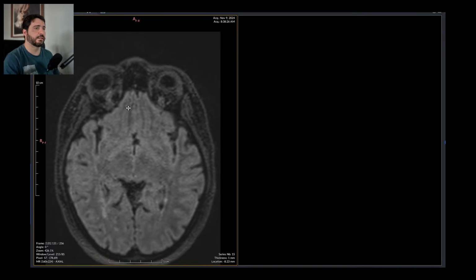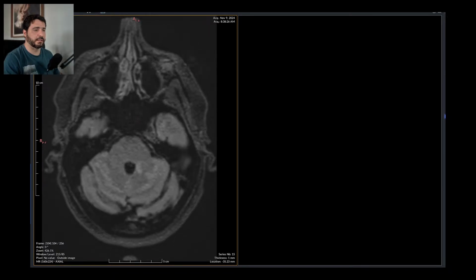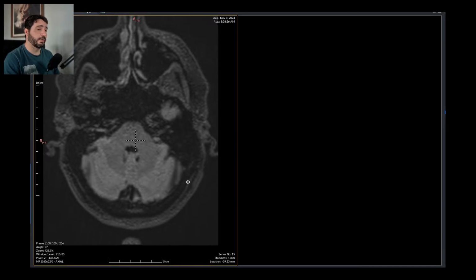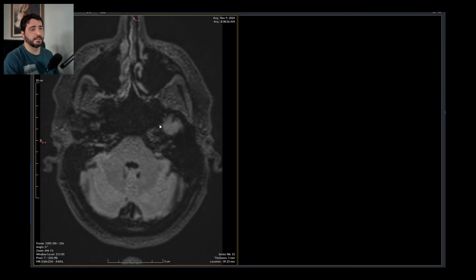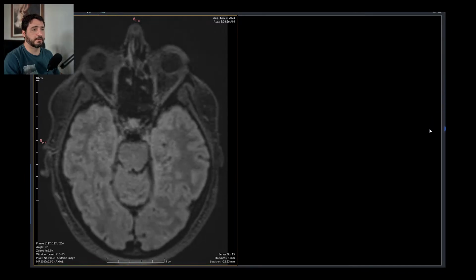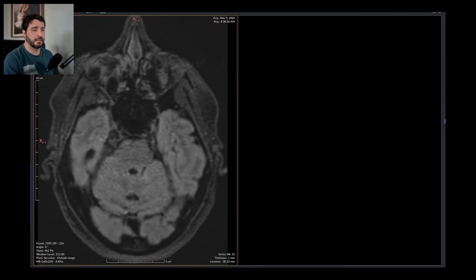So this is a clear sign of a badly maintained scanner, a very badly maintained coil, and also the positioning is wrong because there is a duplicate artifact right there. So the scan itself wasn't properly set, which could be the sole cause of this noisy thing.